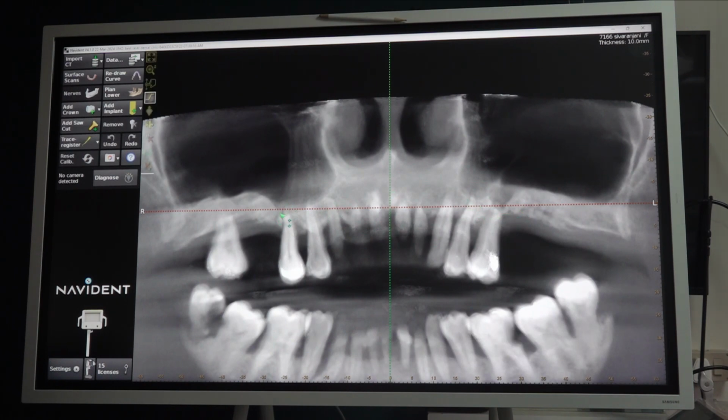This is the second premolar, sinus is closed. First premolar, sinus is closed. Canine also closed. Here somehow the canine, the sinus is respecting the canine and it is stopping here, but here the sinus is not at all respecting and coming anteriorly. So that is the challenge. Sometimes, rarely, even till lateral incisor, the sinus comes.